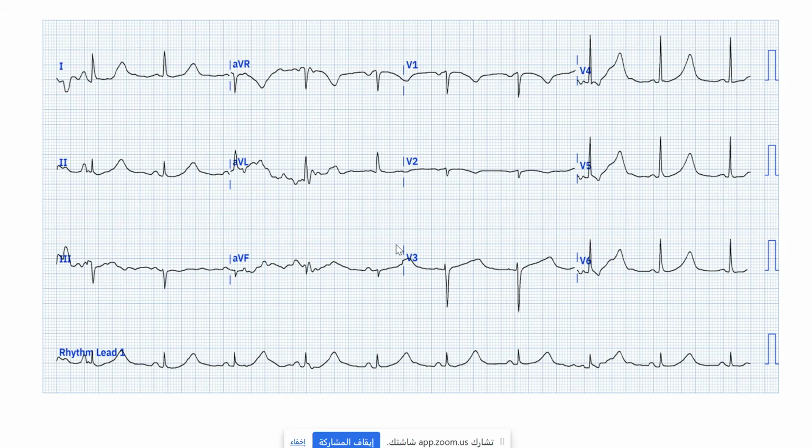Yes, in this ECG there is bradycardia. Which kind of bradycardia? Excellent, you should mention which kind of bradycardia. So it is sinus. We are cardiologists, all of the attendees are cardiologists, isn't it? So you should be very specific. So sinus bradycardia. Agreed. What else?